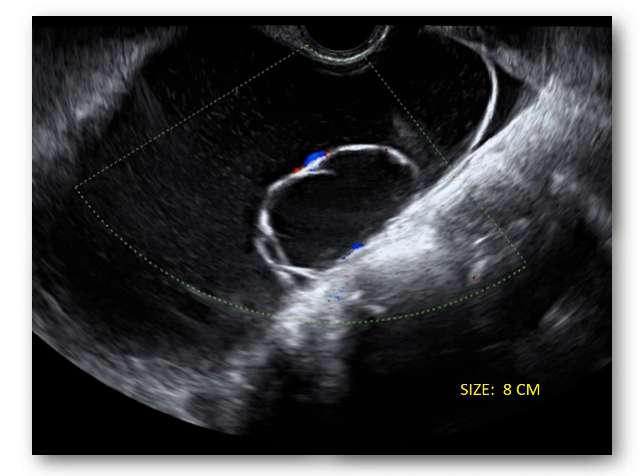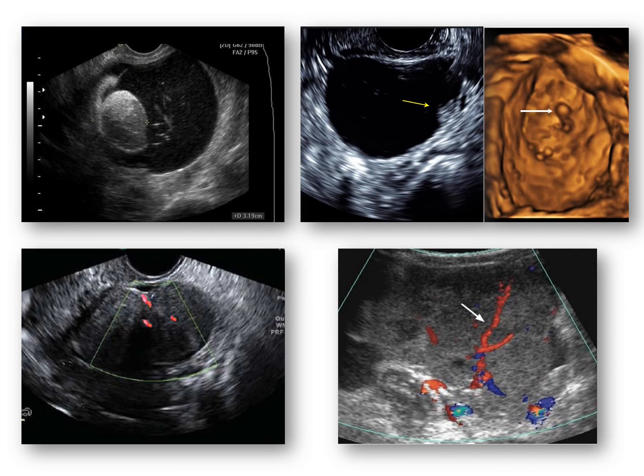And there can be so many others. Like you see a complex looking mass here in the upper left corner. Then you see a mass which is cystic but which has got a nodule which is definitely seen also on 3D. In the lower left corner you have a solid bilobed tumor with a moderate Doppler flow, and here you have a solid looking mass with again a moderate color Doppler enhancement and absolutely no ascites or free fluid. So in these images, it is very difficult to conclude whether it is a benign mass or a malignancy that you are dealing with.